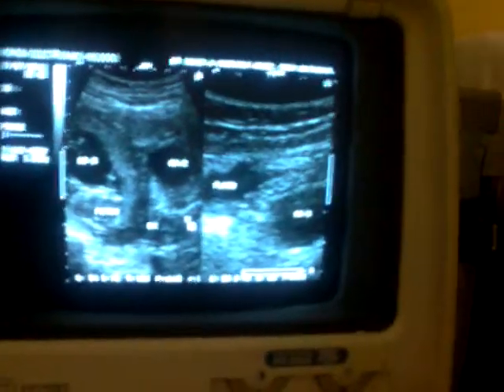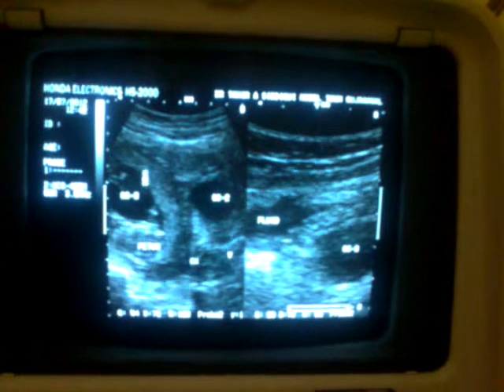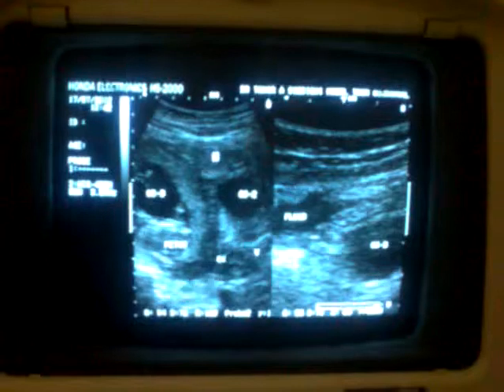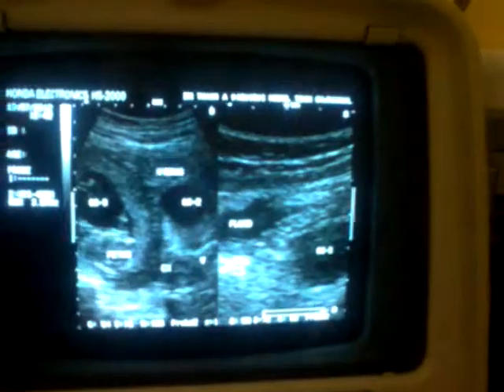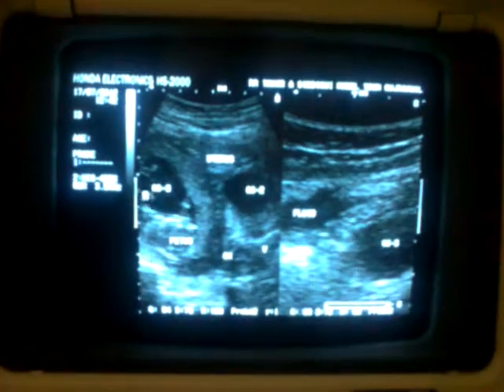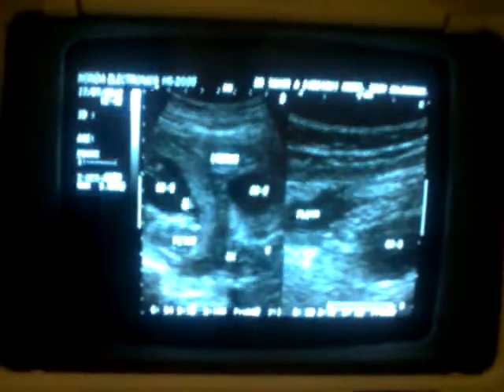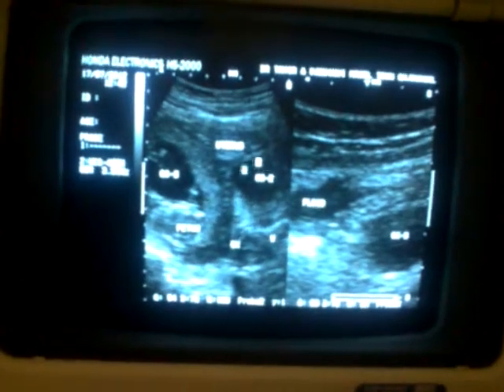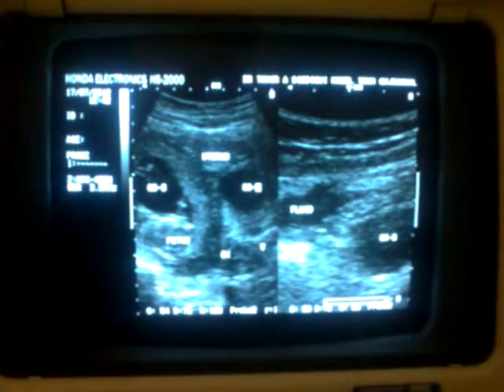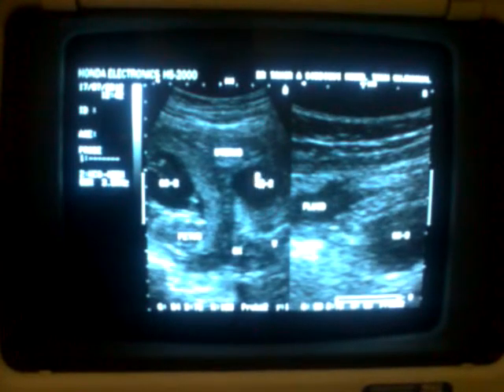Now this is the study, same patient showing gestational sac. This is a subseptate uterus. This is the uterus. This is the uterus with a gestational sac with an intact fetus of 13 weeks in one endometrial canal, and the second one is showing no fetal pole and is empty, is either a blighted ovum or a resolving twin.